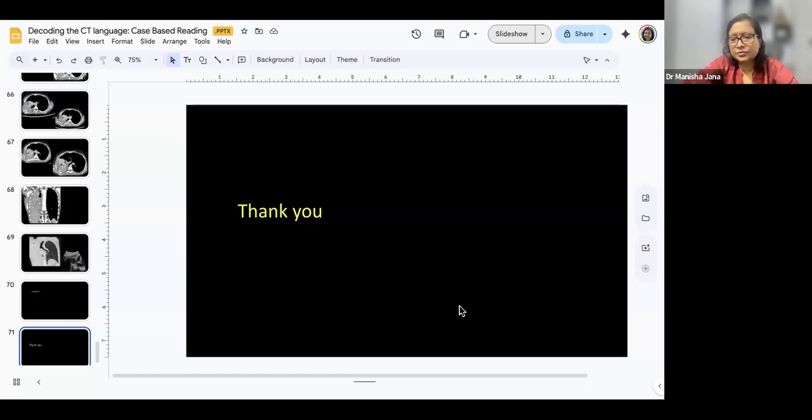And also in cases of hemoptysis, you want to see what is the vessel that is hypertrophied, is there any vessel, any aneurysm that is the cause. So in that case, we do bronchial angiography. If there is a Rasmussen aneurysm, we have to tailor it for pulmonary angiography. Very little difference in timing of the scan, but that will make a lot of difference in interpretation.